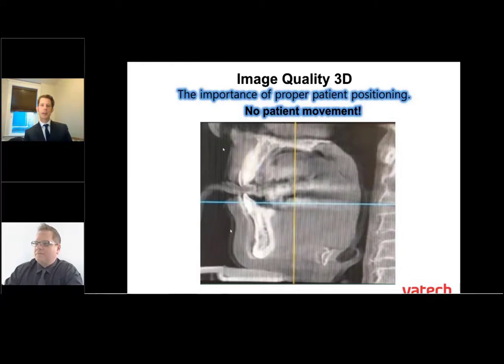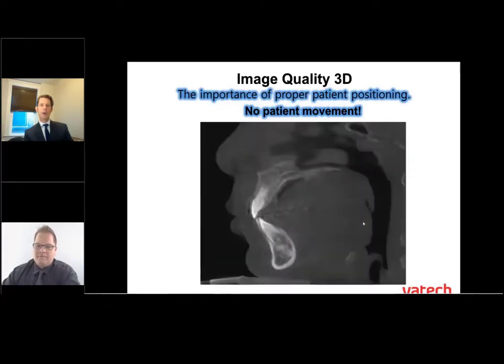And I can see this by this double line here. You can see all these double lines of hyoid bone. You can see an extra line here. So, Paul, what are you seeing in this image here? I'm seeing some ghosting in here, definitely those anterior teeth. You know, the position of the soft tissue, they're kind of like a fluff head. You can see a doubling or a ghosting there as well in that soft tissue there, mainly.